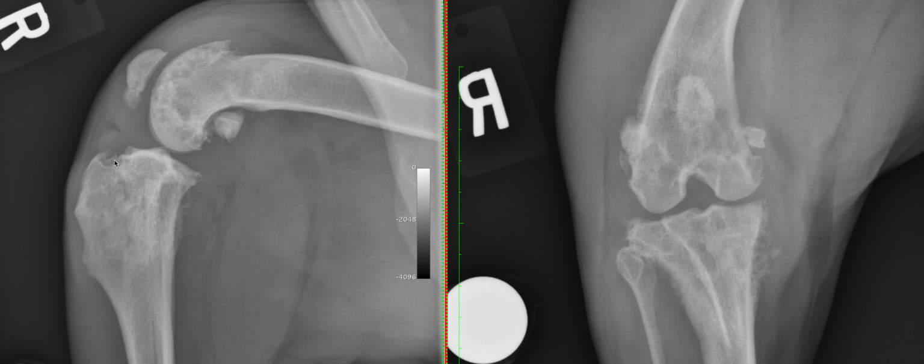And you can see that it would be polyostotic, not affecting just one bone, but the tibia is affected, the femur is affected, so that would be classified as a polyostotic aggressive disease centered over a joint. Something that I didn't mention before is also that you can see that the proximal tibia here, for example, appears quite sclerotic and patchy, but that's probably because of the superimposition of the surrounding heterogeneous new bone that we see here.